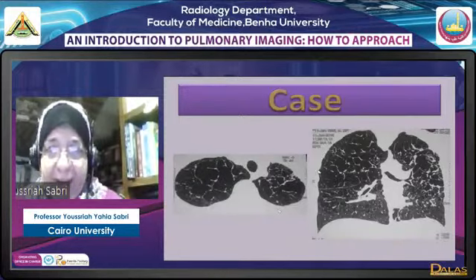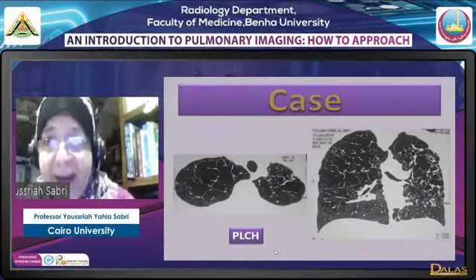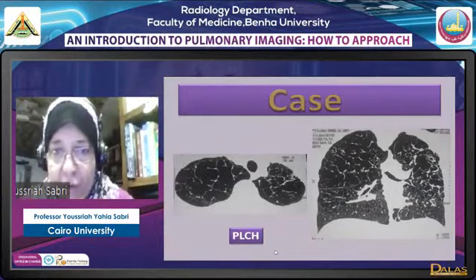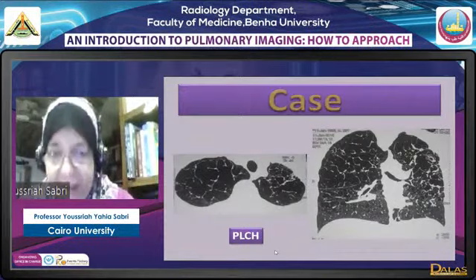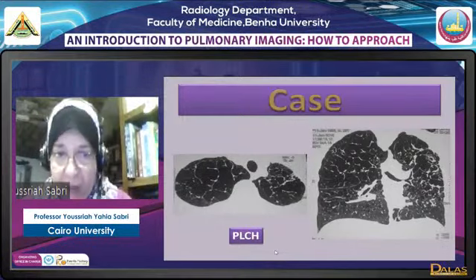Okay, in a young male patient, this is a classic appearance for pulmonary Langerhans cell histiocytosis. Now mind you, pulmonary Langerhans cell histiocytosis is totally different from the histiocytosis of children. Pulmonary Langerhans cell histiocytosis is an interstitial disease of smokers, of adult smokers.